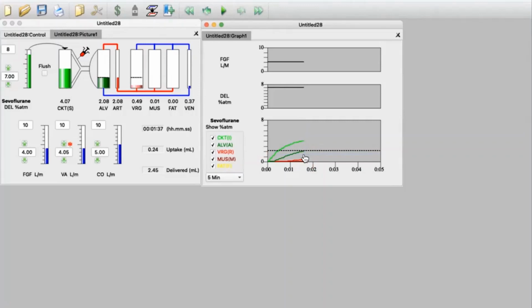So if we then say, I think the patient's asleep, the end tidal value is 1 MAC, the patient would say, but my brain is only at 0.4%. I'm nowhere near asleep. You really want to get me up to at least 1/3 of MAC, maybe 2/3 of MAC, or maybe a full MAC before we start doing anything significant.